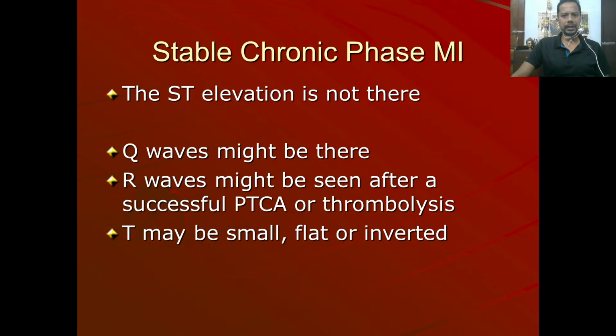Now there is a state called stable chronic phase of MI. After the MI has occurred and few weeks have passed by, the ST elevation you will not see anymore, and there will be Q waves, and there can be R waves.